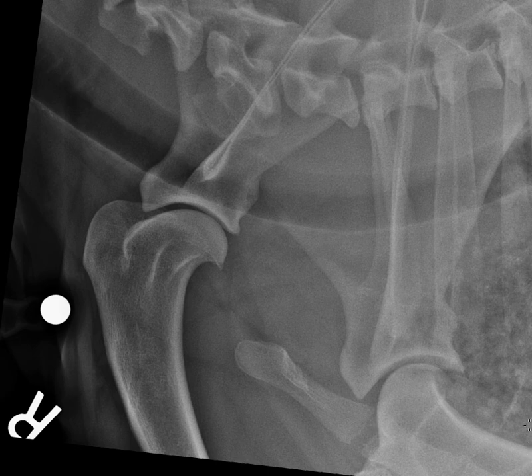So what I want to bring your attention to is this area of lung that's included on the edge of the field of view. You can see that where the cranial thorax is included in the study, instead of having nice crisp lung fields, we have the impression almost of a nodular appearance within these included lungs.